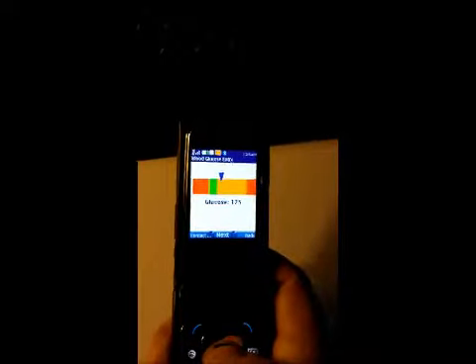The red is, of course, the danger zones, the green are the target areas, and the orange are the areas which are of caution. This just shows what it looks like over the last couple of days in terms of a graph. 145, you can see 115, and it gives you sort of the trend. So I'm done.